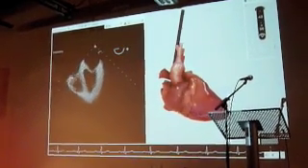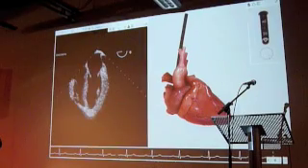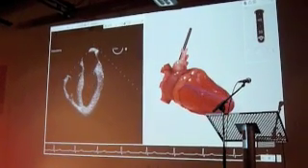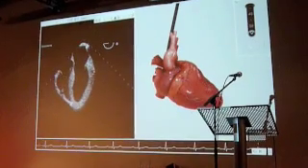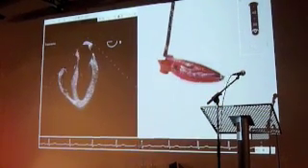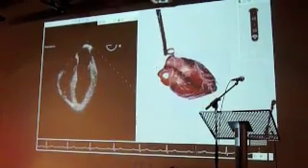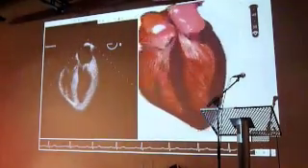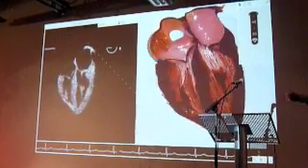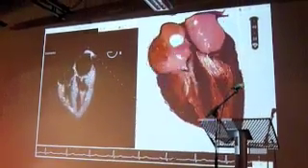So if I push it down to about a mid-esophageal position, retroflex my probe slightly, so I'm getting a standard 4-chamber view of my heart. Now, it's not entirely obvious how that ultrasound image correlates to my 3D anatomy, so I can then slice my heart down that plane of sound, and then put the two alongside, so you can actually see, students can actually then see exactly how that 2D image is being generated from this 3D structure.